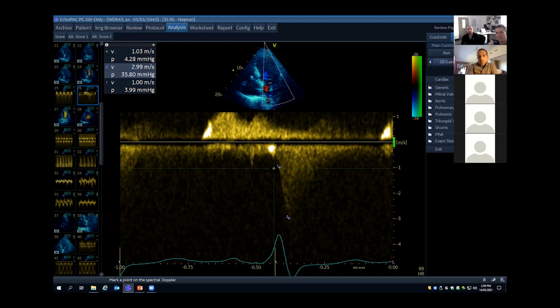That's the measure they use in a cath lab when they're doing invasive measures of systolic function, and this is the way that we cheat doing it on echo. But if you're going to measure it, you can't do it with 5 cardiac cycles on the screen. You've got to make sure you've just got the 1 you're interested in filling the screen.